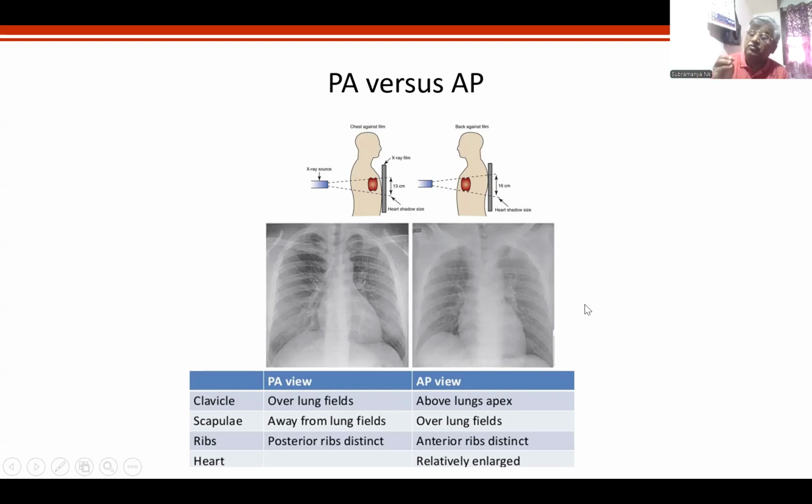So therefore, what did I say in the first remarks of mine? Any shadow on a bony tissue will appear more exaggerated. Now, if I tell you, on a scapular shadow, if you have mild pneumonitis, it appears as a moderate pneumonitis for you, a moderate density pneumonitis for your visual impression. Therefore, any background shadow will actually affect your interpretation.